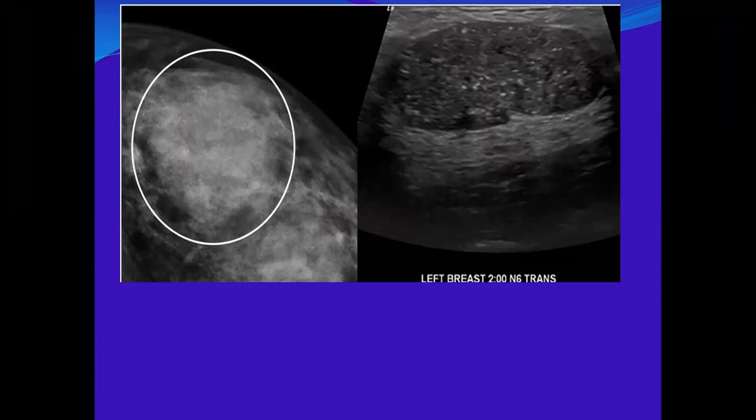The time is passing, yalla. So I will consider the biopsy. Yes, I agree with you. But do you suggest any diagnosis? Yes, phyllodes. Can I say phyllodes? Yes, phyllodes is accepted. What else? If it is not phyllodes, yes.